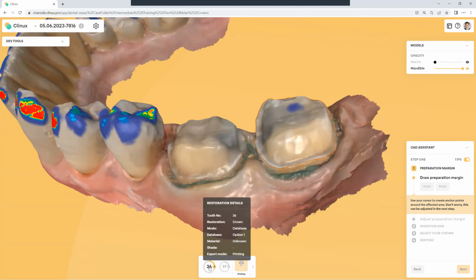With a double click, I make my first start of the margin, and then with single left clicks, I'm now going around the margin, and every few, I don't know, millimeters or so, or less, I'm making single left clicks to lock that margin down onto the tooth, as you see here. And so you'll also notice I'm rotating the model a little bit.